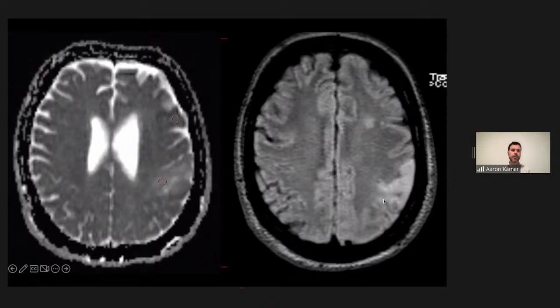Why don't I pick on Dr. Stephen Leonard? Are you available to tell me what you see on these images? Yes, I'm here. Okay. So it looks like I see some thickening of the cortex, some increased T2 signal associated with that thickening on the right, and then on the left I think is an ADC, and it's high on ADC.